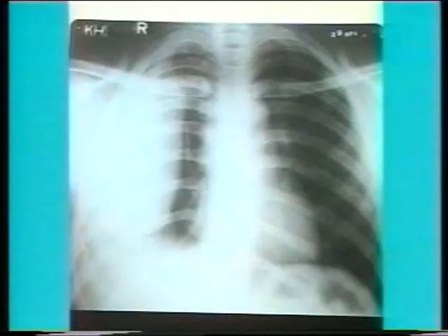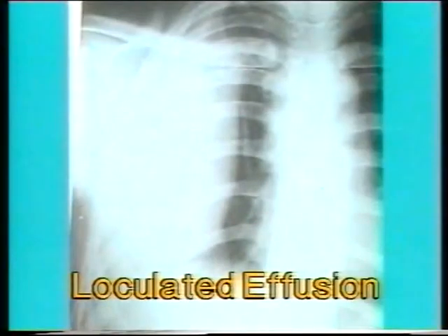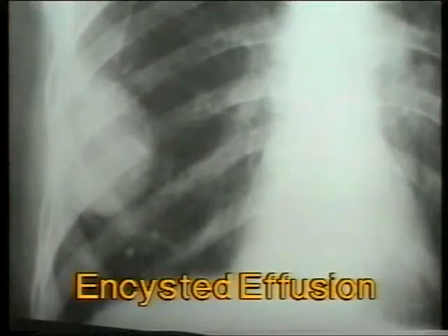Now in this X-ray, there is a homogeneous fluid opacity with a smooth curved border, but it has not concave but convex border. This is an encysted pleural effusion where the fluid is loculated due to pleural adhesions. The opacity is peripheral and its convex border is towards the lung. This is characteristic of an encysted or a loculated pleural effusion. This is another opaque peripheral shadow with convexity towards the lung, which was an encysted pleural effusion. A similar shadow may be seen with a cold abscess arising from the ribs or an extrapleural mass.